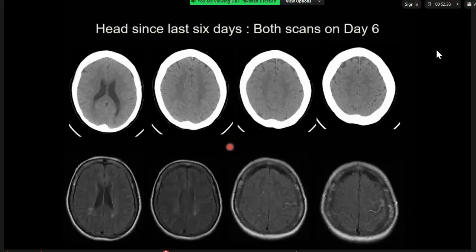So I can see the non-contrast axial CTs, but I can't see any acute intracranial bleed or subarachnoid blood. Looking through the FLAIR sequences on the third and fourth images, I can see there's some high FLAIR signal in the subarachnoid space and in the central sulcus on the fourth slice.